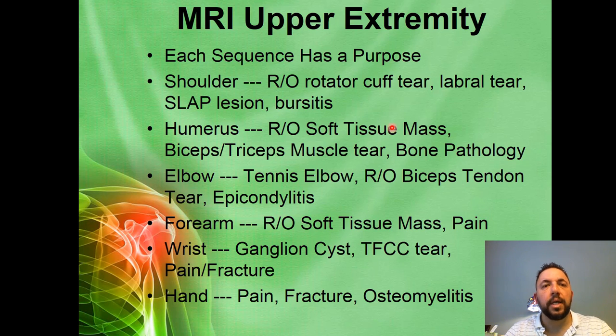In the shoulder, as we start with them, we'll work our way from upper extremity, proximal, and work our way distal, and then we'll do the lower extremity, same thing. We'll start proximal and work our way distal as we get through the entire orthopedic MR lesson.